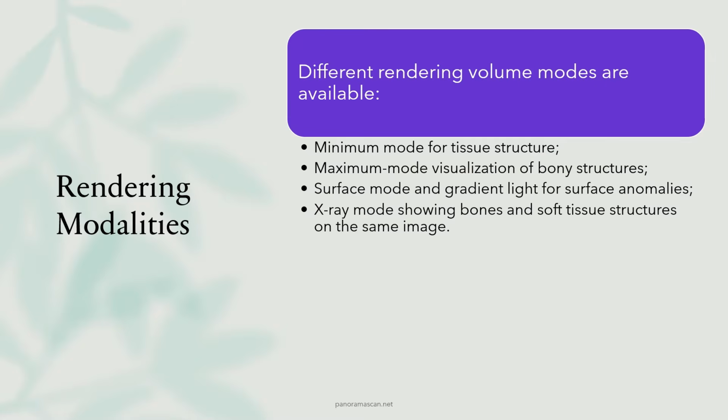By selecting the appropriate rendering modality, the clinician can tailor the imaging to the specific needs of the case, ensuring the most accurate and informative visualization possible.